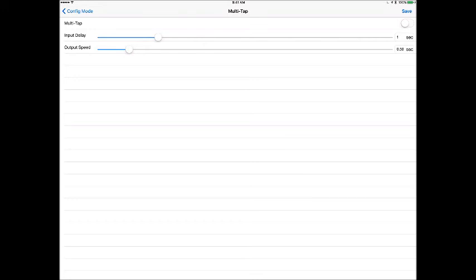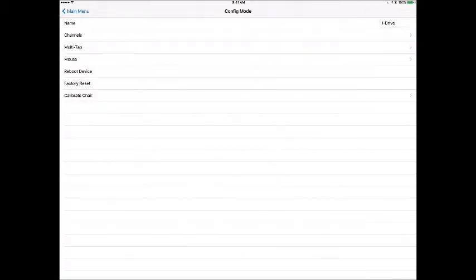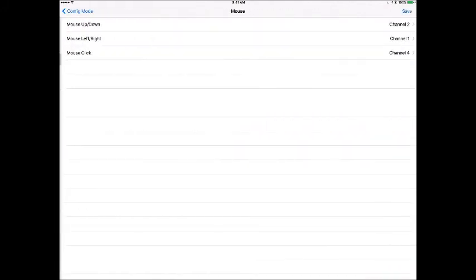Of course, chairs have that feature too, that you can go into programming and do it, but we wanted to give you an additional function here that you could get into and play with in case you were having difficulties with the function that comes on the chair. And of course, like I mentioned before, here is the mouse.